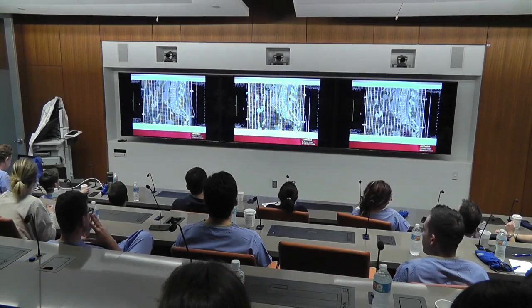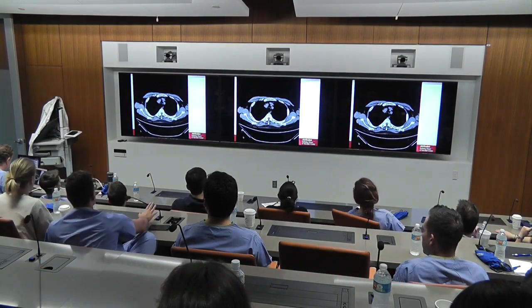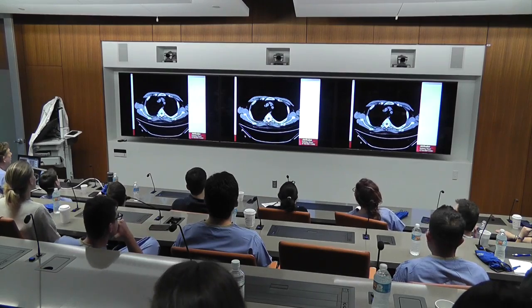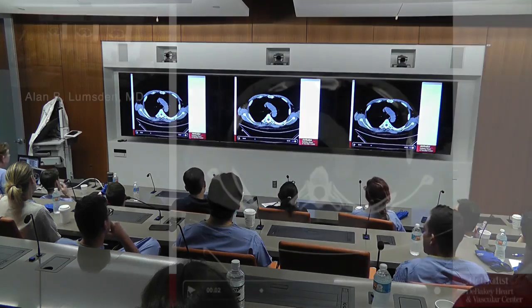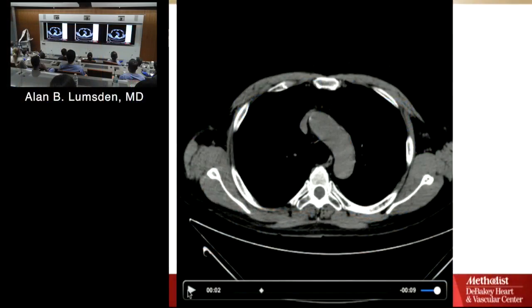Okay, Travis, you're unfortunately in the hot seat all the time. So we start with you, and we're going to walk through this bad boy. Tell me what we're looking at. It's like the arch. No, tell me about the study. What is the study we're looking at?